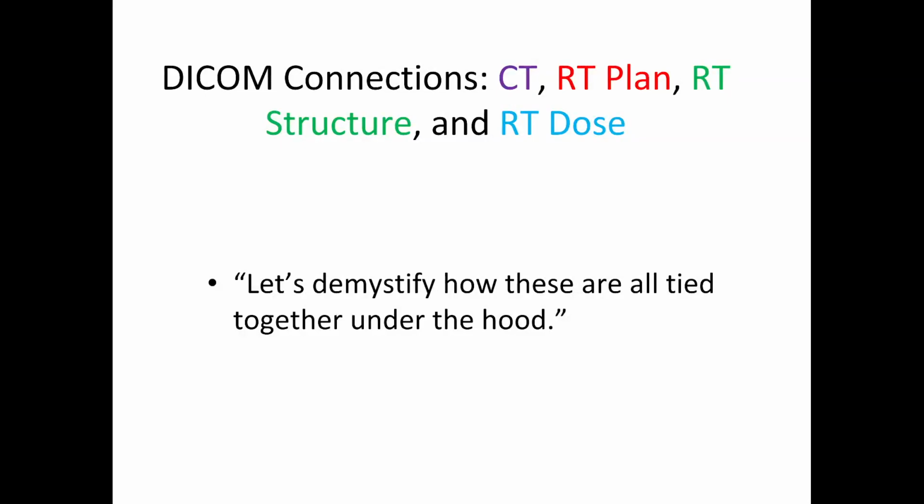Today we are going to demystify one of the most important but often confusing parts of radiation therapy planning: how your CT, RTStruct, RTPLAN, and RTDOSE files are all tied together behind the scenes. These four file types form the foundation of treatment planning, and making sure they are properly linked is critical for accuracy, safety, and compatibility.